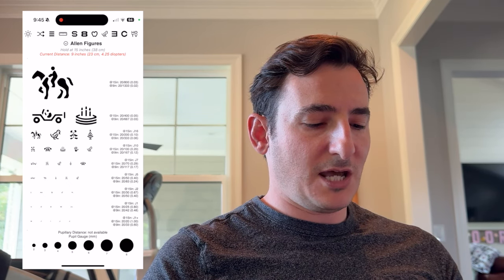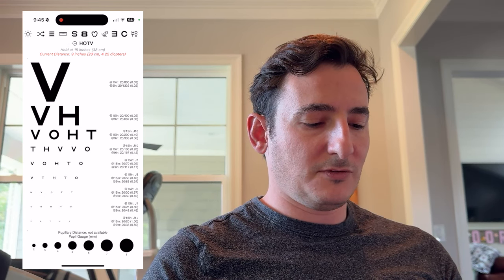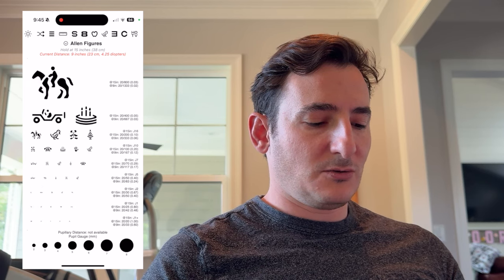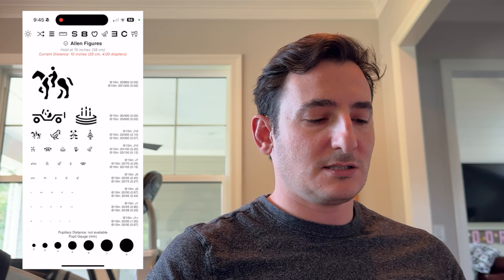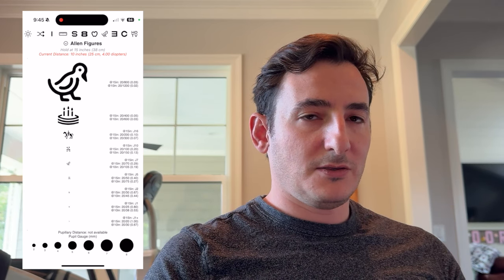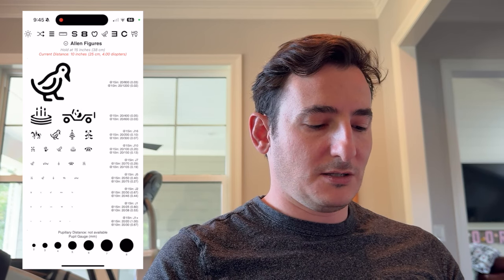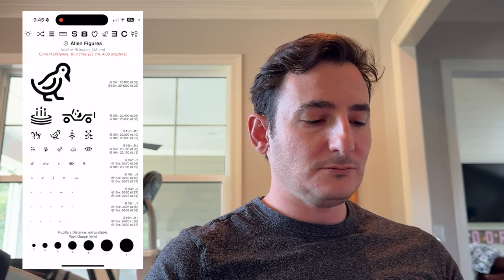Adjacent to this, you'll see our different optotypes that are available. So again, letters is the default mode, but we have many different optotypes. So if you tap each one, you have numbers, you have pediatric options, you have nonverbal options, all at the tap of your finger. A nice thing to realize too is no matter what optotype mode you're using, all the navigation modes will stay consistent and all the buttons will work. So you can click shuffle, shuffle will still work, the different viewing modes will still work, the different imperial metric system modes will all still work.